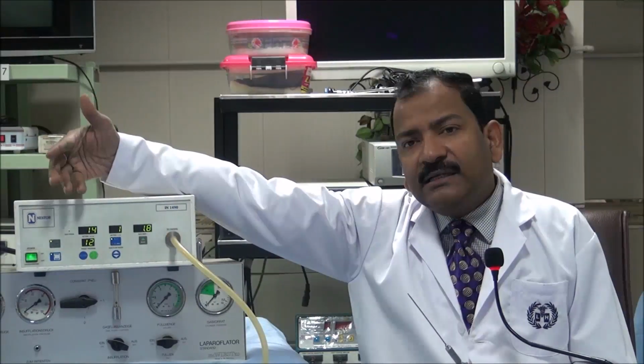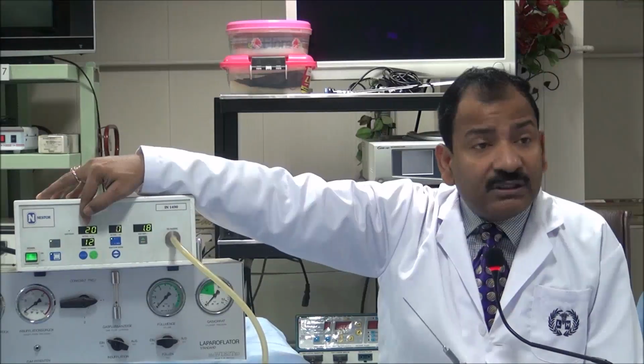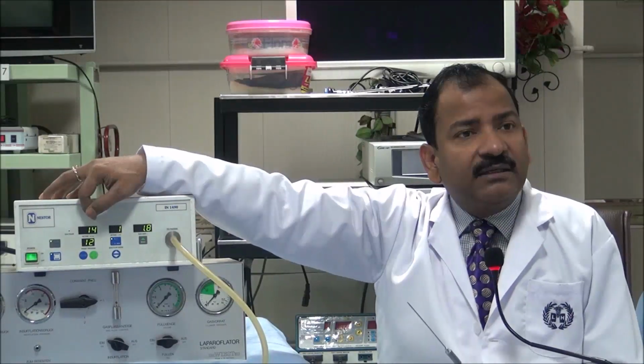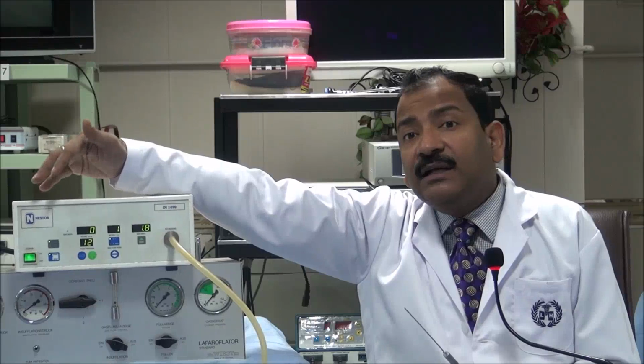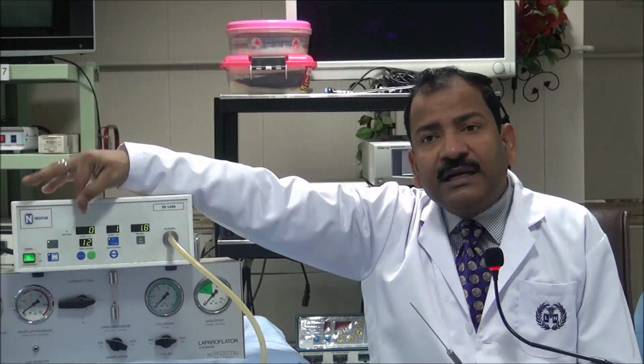The actual pressure is varying, and that is one of the reasons sometimes the gynecologist or surgeon panics, thinking they are going somewhere wrong, and takes the Veress needle out, although it was in the abdominal cavity. After seeing these fluctuations in the actual pressure, they panic and think they are in the wrong place.